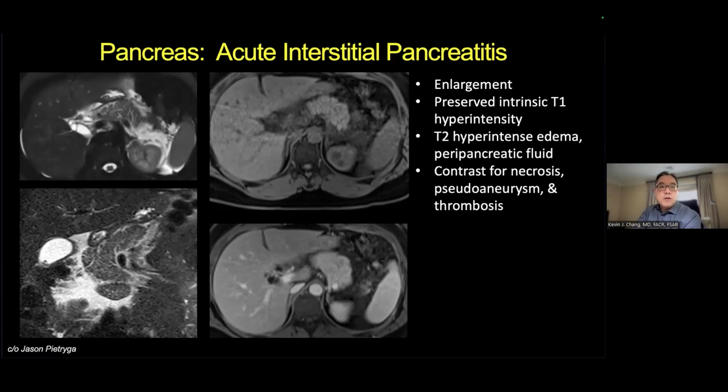You're also going to be looking for other complications following contrast administration. Pay particular attention to the vessels, looking for any erosion of arterial structures causing a pseudoaneurysm, or the thrombosis of other structures, especially the splenic vein and superior mesenteric vein and portal vein.